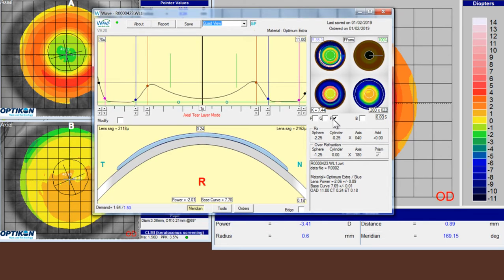Because this is a freeform lens, one thing I would strongly recommend doing is going into 25% mode at this point and going through the different meridians. You can see that we're not quite at 2, and this will be in 1x because this will be just fine-tuning. And if we click through, we can see that there's just a little bit of variability that we can fine-tune. 25% mode, 1x, and just to make everything as close to 2 as possible.